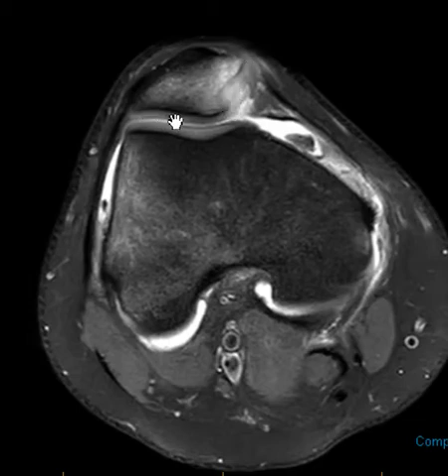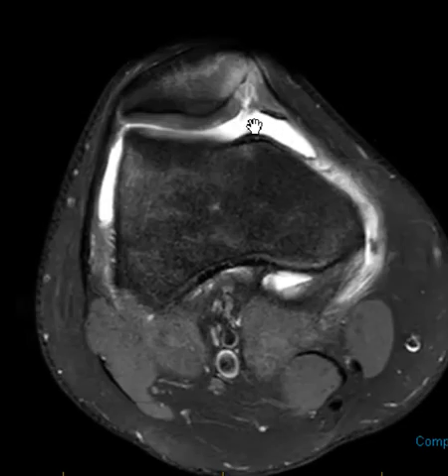This cortex is the black line. It comes down here, and then it's impacted by about 5 millimeters. Right here, impacted. We see the underlying marrow edema and the articular cartilage, which is the gray band here, this thick gray band, superficial to that black cortex. Nice, normal. Here's the apex and the medial facet.